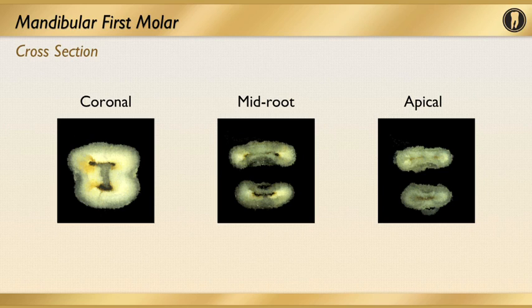And notice the broadness mid-root of the distal canal. And apically, we notice that there is loss of that broadness coming more to the centralization of one terminus, but we cannot neglect the presence in the mid-root and the coronal 1/3 as far as the anatomical irregularities for the mandibular first molars. They must be appreciated for proper cleansing and sealing of the endodontic case.